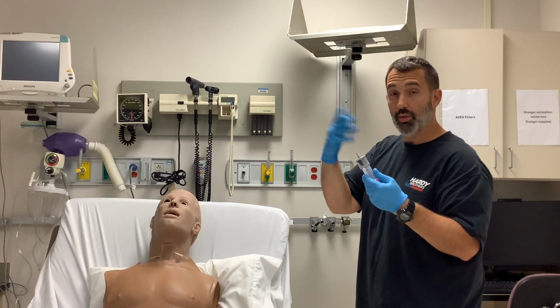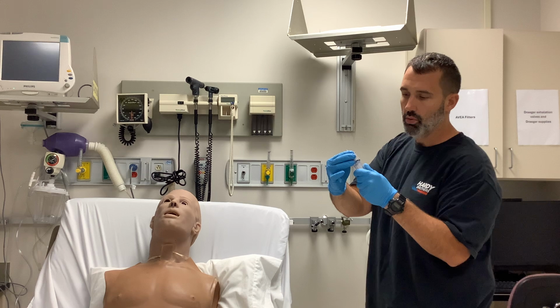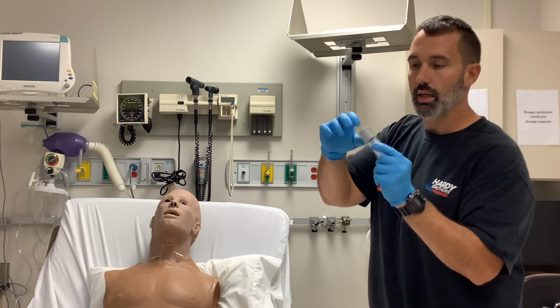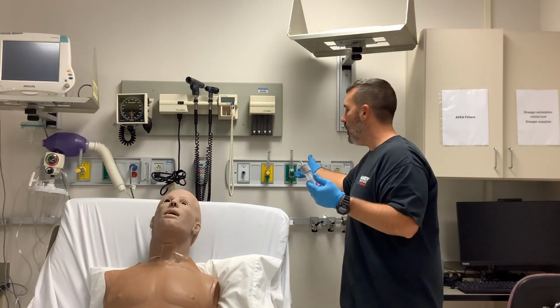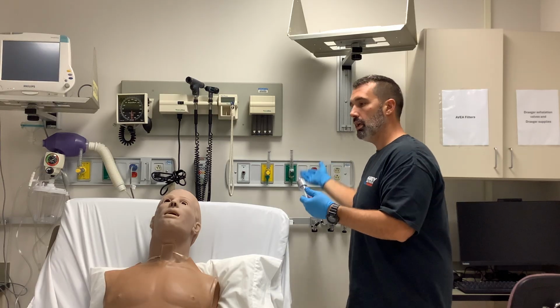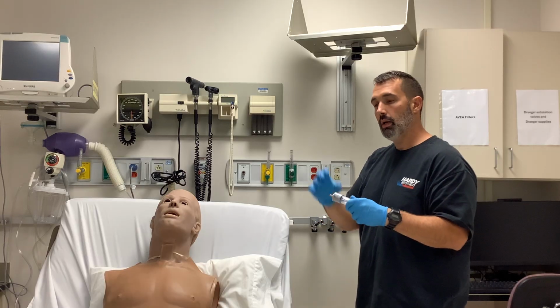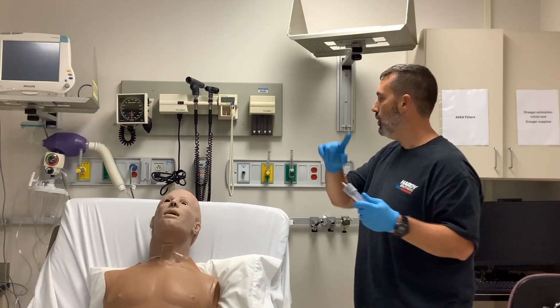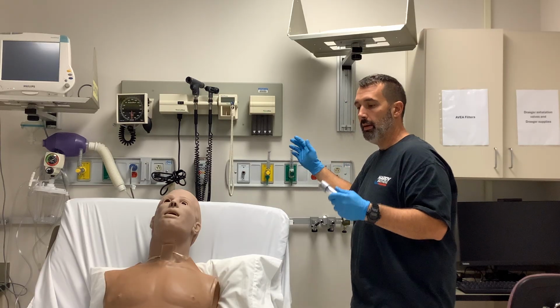So then obviously on the flip end of that, the higher the percentage of oxygen that I set, so this one will allow me to go to 90%, you'll notice that that window is essentially closed off, because at this point you want 100% oxygen or 90% oxygen going to the patient. But you've got to be careful with that, because obviously the less air that gets entrained, the more dependent upon you are what the liter flow of the oxygen flow meter is at that point.